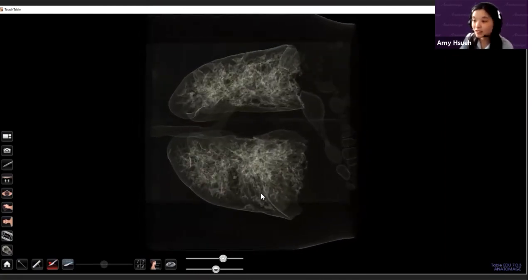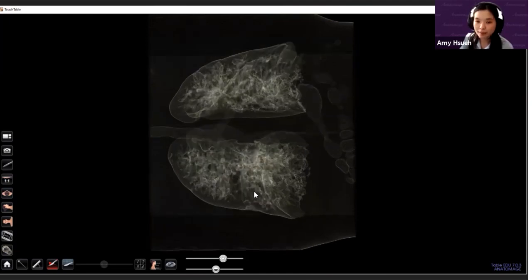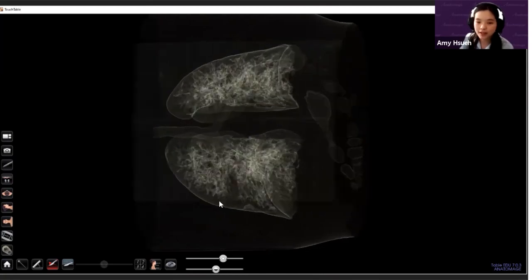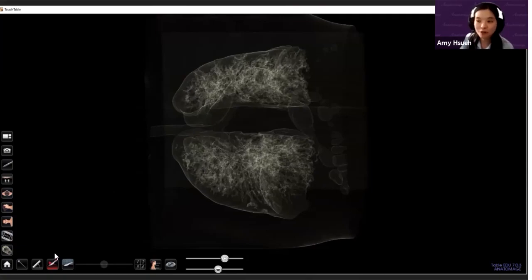The coronavirus scan is actually included in our 703 update already. So if you have that update, it's case number 7200. And it will definitely be included in our Table 8 update as well. You can definitely see the classic, kind of glassy look of the coronavirus here. You can still clip through them, create your own presets, annotate everything, do measurements, all of that.